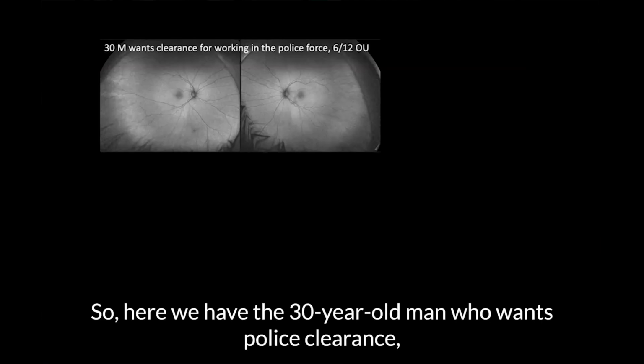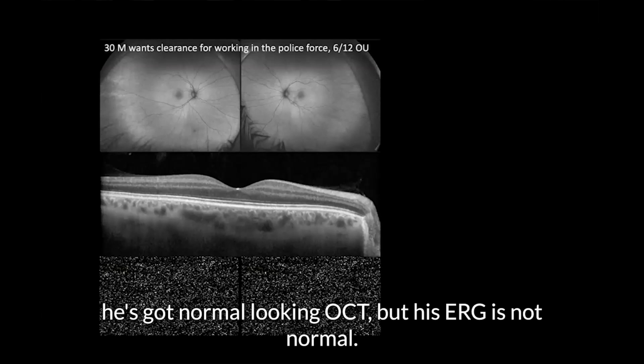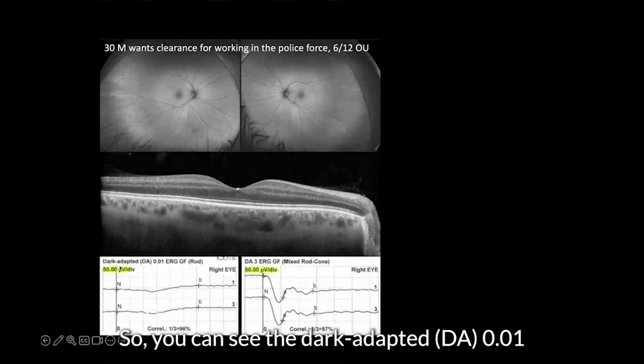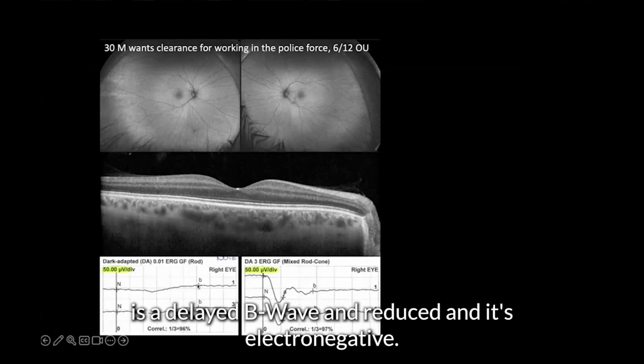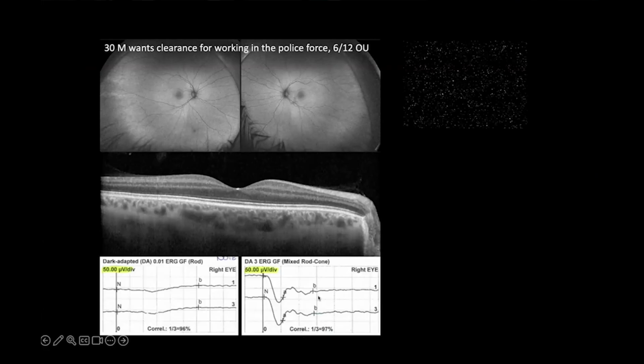So here we have the 30-year-old man who wants clearance to work in the police force. He's 6/12 in both eyes. He's got a normal looking OCT. But his ERG is not normal. So you can see the dark adapted DA 0.01. There's a delayed B wave and reduced. And it's electronegative. You see the A wave is good, but the B wave severely reduced.